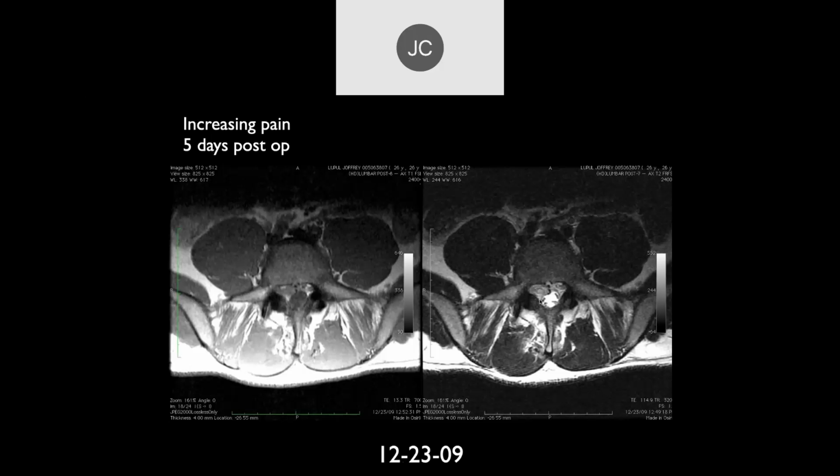The thing about this case is it would get better without surgery. If he's not a professional athlete, sequestered discs like that all resorb, and usually they're asymptomatic within 9 months. But by doing surgery, they can immediately relieve the pain, and often they get back to playing earlier. But then you've got risks like this, and there's complex fluid in the area where the disc was.